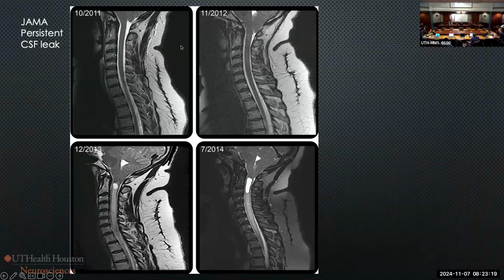We don't develop a Chiari malformation. If anything, the tonsils ascend and you get more room around your posterior fossa with time, not less. So that would be concerning. Hopefully you would see some crowding of the midbrain, but at the very least now after today, you're going to get a brain MRI with contrast and you're going to look for all the findings of CSF hypotension before making the diagnosis of a Chiari-1.